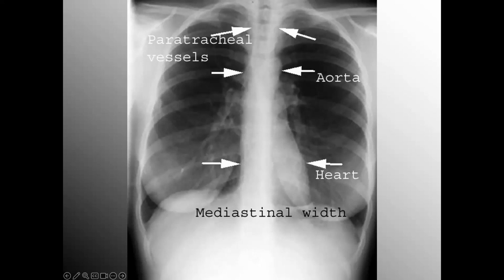What you're looking at here, I'll give you a little bit of insight what's to come. You've got somebody that has hyperlucency. You see how it's more black in the mid-lung than it is anywhere else in the lung fields? Now, some could argue you've got breast tissue overlap, but there's several things to note here. You've got an increase in rib spacing. You have hyperlucency in the mid-lung.